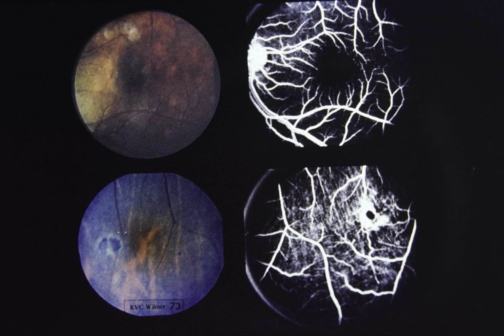Arterioles were occluded permanently and visual acuity remained 20/70. Lower left is the inferior fundus of a 29-year-old black female with hemoglobin SS. Dark lesion with white border has been likened to the appearance of a black sunburst. Lower right, 13 seconds after dye injection, hemosiderin-laden macrophages in the center of the lesion obstruct background choroidal fluorescence. Hyperfluorescence along perimeter of lesion corresponds to depigmented area seen on color photograph.